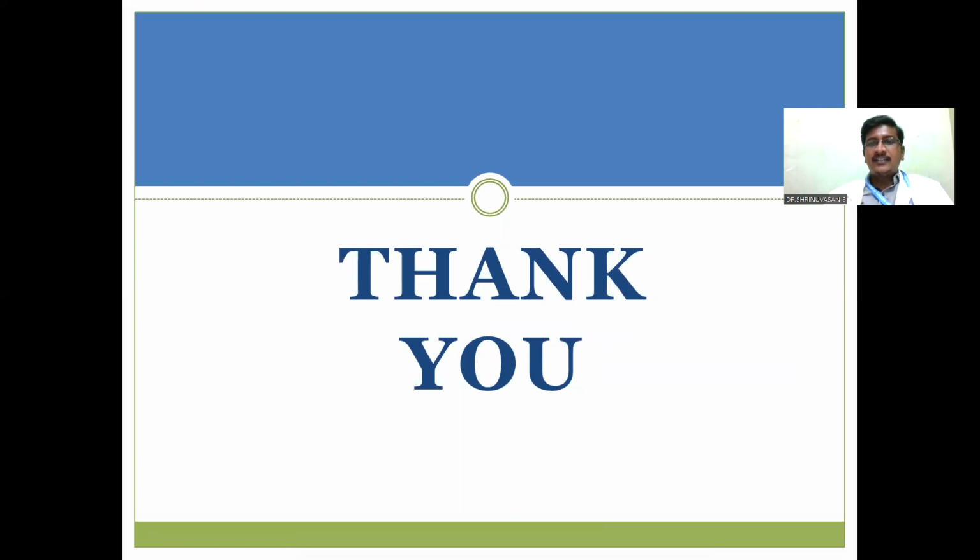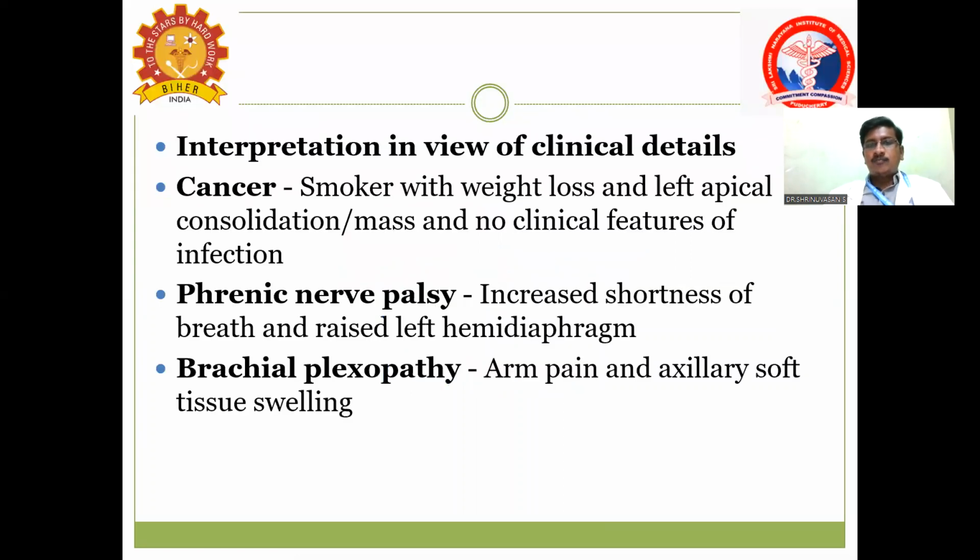Okay, thank you very much. I will summarize whatever we have discussed. This is a basic interpretation of chest X-ray class, and we have seen what we mean by X-ray, which spectrum it belongs to, what a chest X-ray is, what the different views of chest X-ray are, and how it helps in identifying pathology.